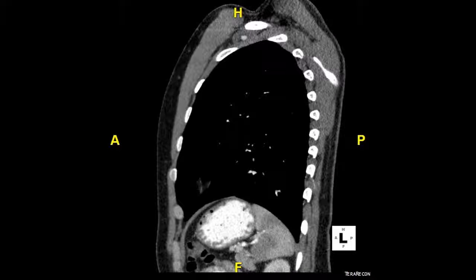In this first image, the first thing I want to do is just outline the thoracic cavity. Keep in mind that the diaphragm, which I'll outline here in red, just the edge of it, separates the thoracic and the abdominal cavities. Therefore, we'll be looking at everything in the thoracic cavity. I'm just going to roughly outline it here, just the entire area above the diaphragm. Let's start scrolling through the images and see our first major landmark.